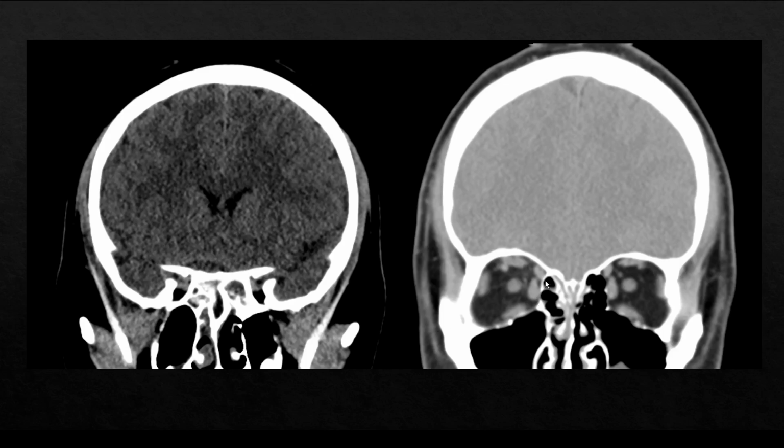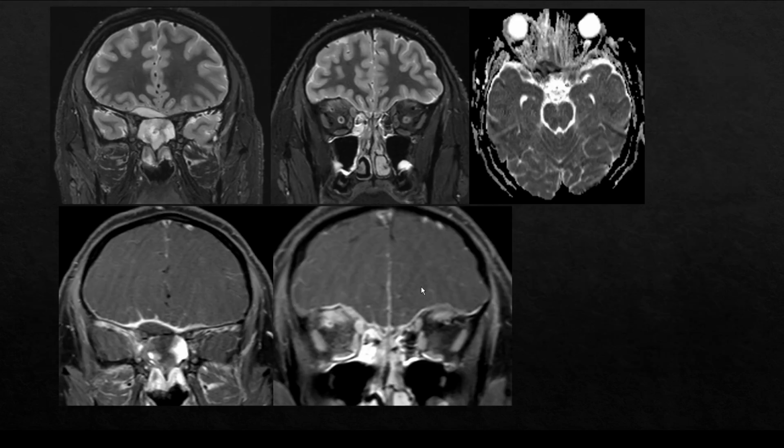and we also have on soft tissue windows abnormal material within the right orbit, fat stranding within the posterior aspect of the right orbit. Both of these are very suspicious for spread of infection, and an MRI would be recommended to better evaluate the extent of disease. Look for other complications as well.